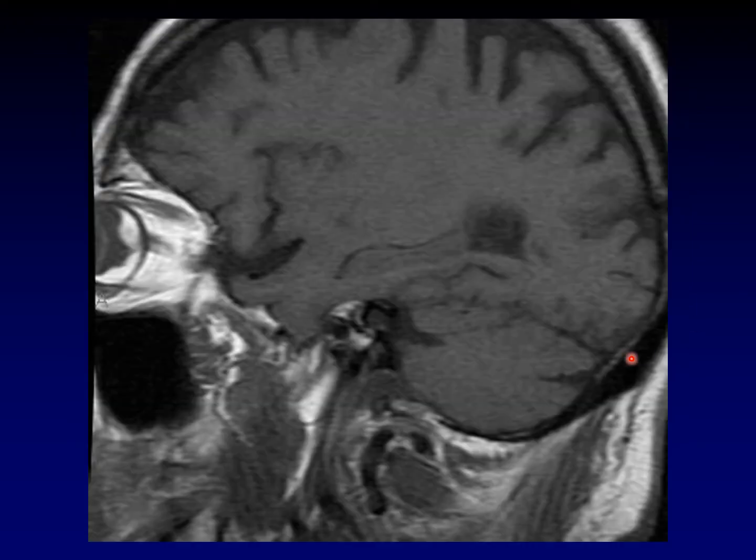You can even pick these up sort of incidentally on other imaging. This is obviously an MRI of the brain where we can barely even see the globe, but look at that. There's that V-shaped configuration coming to a point at the optic disc. That is a retinal detachment, probably a chronic retinal detachment. That's why it's no longer a straight line. It's got that wavy appearance as the clot slowly resorbs.